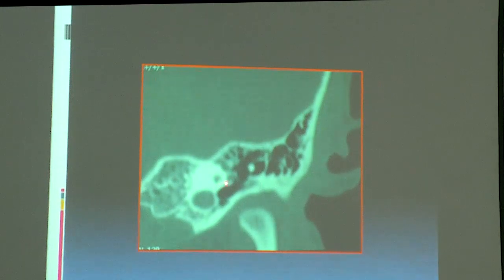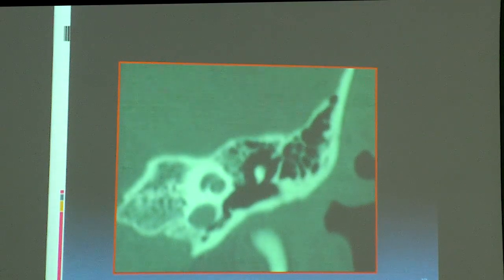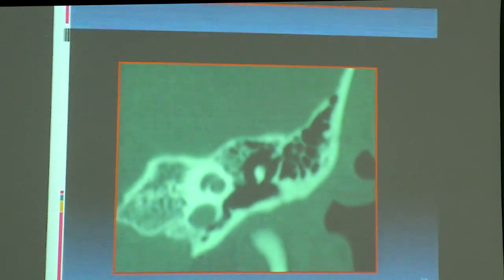This is the beginning of the cochlea and here you can see the muscle. We see the head of the malleus, we can see the entire tendon. And I don't know if you can appreciate it, there is one dot here and there is one dot here. So this is the tympanic segment, this is the labyrinthine segment. And you can see the cochlea has pushed the carotid downwards. So carotid has begun its downward journey to become vertical.